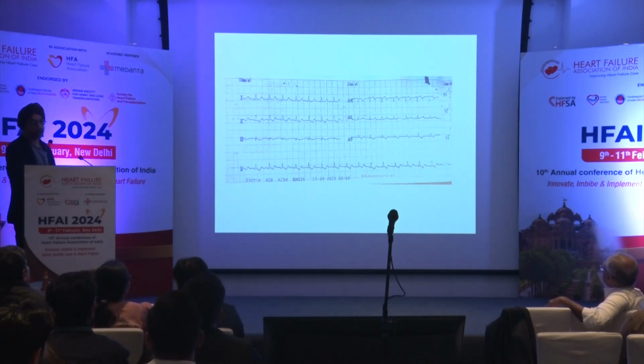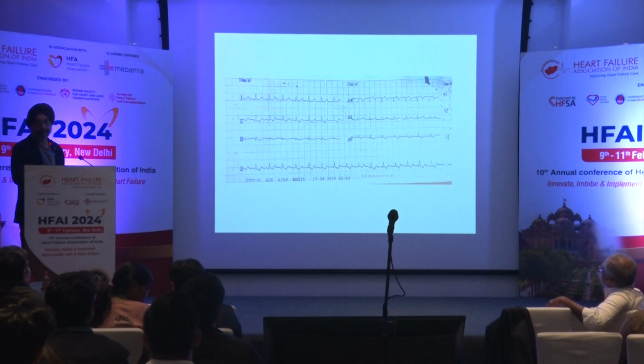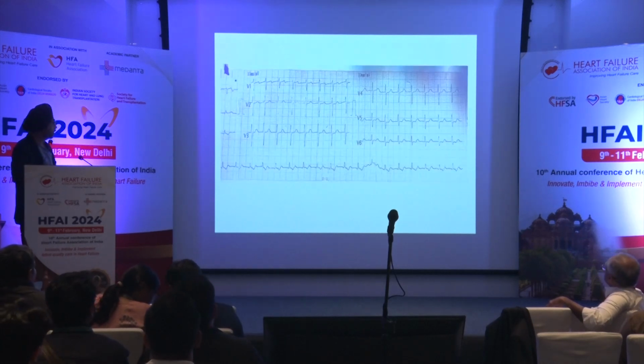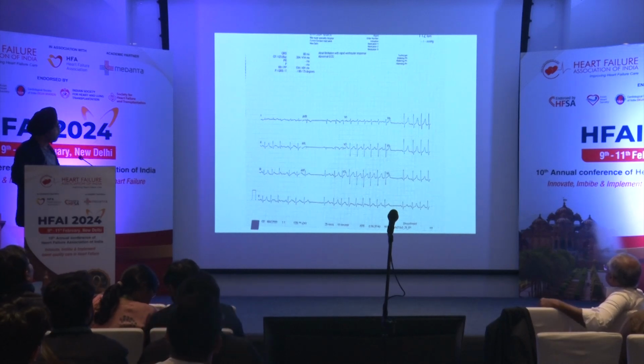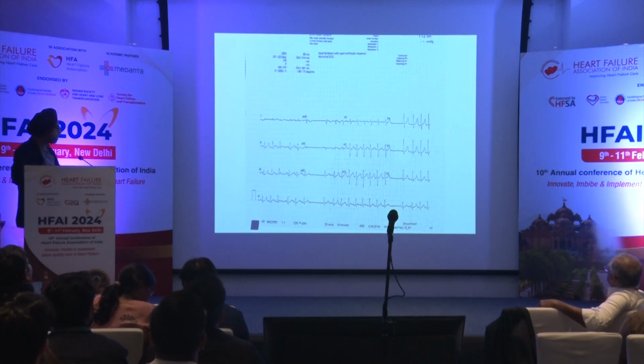Okay, so this patient underwent an EP study with an AV nodal re-entry tachycardia, which is a great success for us. She's fine. Let's go to the next. So this is a young guy, 22 years old, comes with one of the ECGs, and I will show you another one.